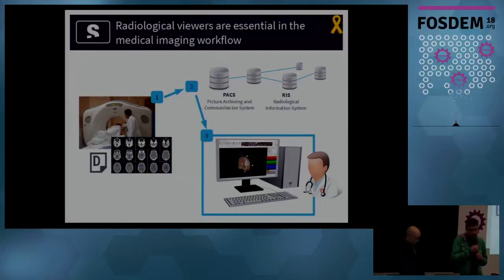Radiological viewers are essential in the medical imaging workflow. First, a technician acquires images in a medical scanner. These images are then stored in a central server called PACS. And then radiologists can retrieve these images through a radiological information system and view them in a radiological viewer.